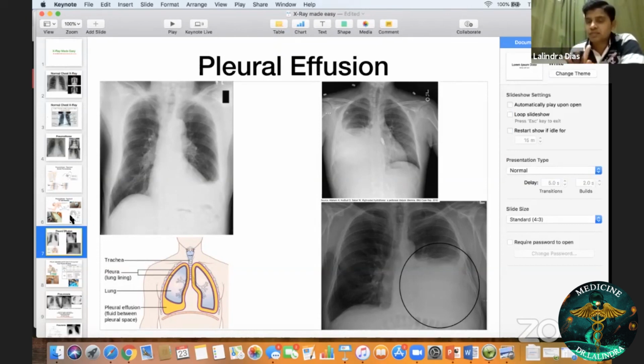What about the bones, which contain calcium? Whatever calcified lesion, or when you have calcium, calcium is mainly contained in bones. So if you have calcium or bones, they appear even whiter, a very bright white color. So black, white, whiter shadows. Here pleural effusion is water, so it should appear in white color.